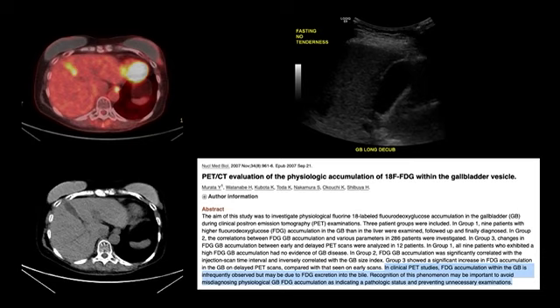So this case is interesting because it shows excretion of FDG from liver into the gallbladder. I have another companion case of another gallbladder pathology.